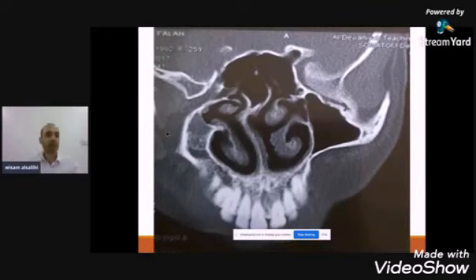If anyone does a FESS for this patient, there will be a complication, at least orbital injury, even with a traditional antral wash, because there is no maxillary sinus. So it is very important to do a CT for every patient if you want to do FESS.